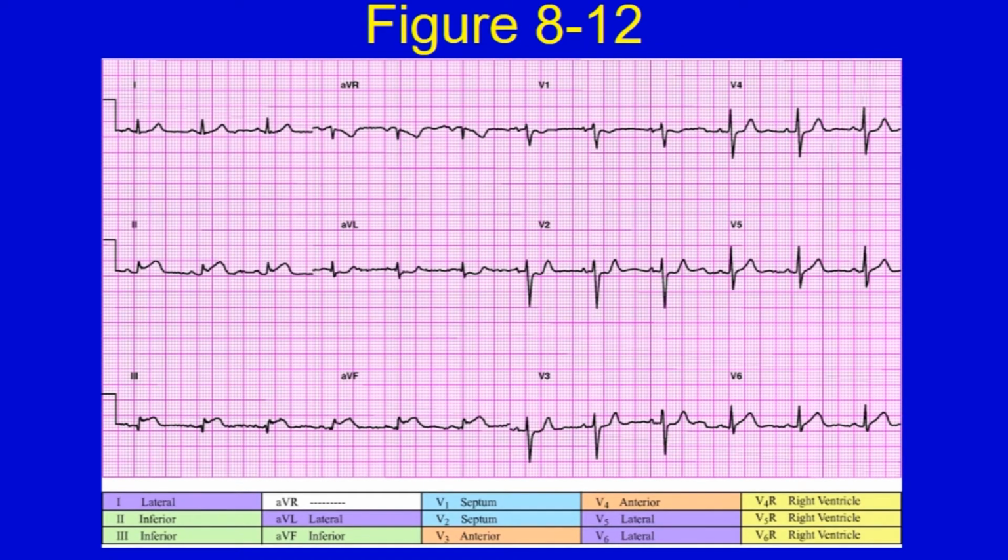Go to this one. I was running through these and I just chose some, so. All right. Can you fairly quickly make a decision that we ought to really pay attention to this one? All right. So tell me, what's the part of this that's got your attention?